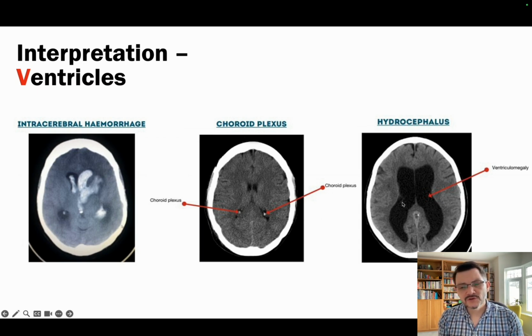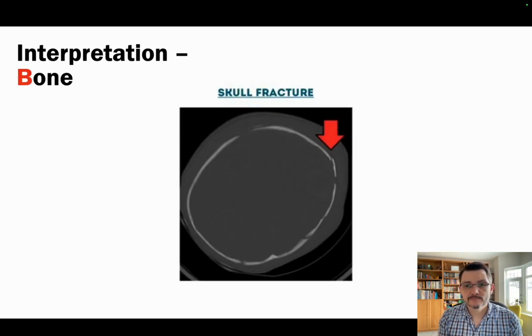And then you've got hydrocephalus, and you can see in this individual those ventricles are much, much larger than we've seen in all the other scans, and that's ventriculomegaly. It can be difficult to tell whether ventricles are enlarged in an older person because the brain may be just shrinking generally, and therefore giving the ventricles more capacity to look bigger. But we know that in that individual that is definitely enlarged, and anything that looks that grossly enlarged would need to be investigated as a possible cause for symptoms, and therefore a non-stroke diagnosis.